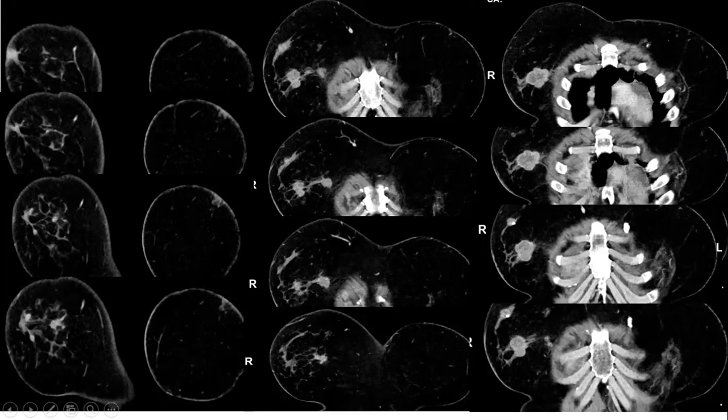You see, these lesions interconnecting, giving you the added density, okay? And this is the nipple in the contralateral breast, but the whole area is fatty. I could not appreciate. And again here, these are the lesions interconnecting. Look how the band-like density seen on mammography.